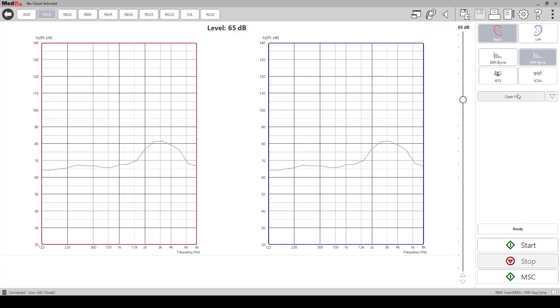When performing open ear fittings, the sound amplified by the hearing aid leaks outside the patient's ear, where it is being picked up by the reference microphone. Because of that, all stimuli that run with auto-level compensation, such as speech-weighted noise or pseudo-random noise, tend to set the SPL at the ear incorrectly or lower, as the reference microphone is biased by the sound leakage from the ear.